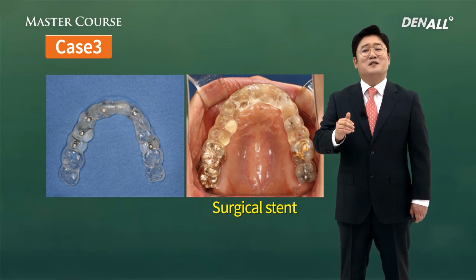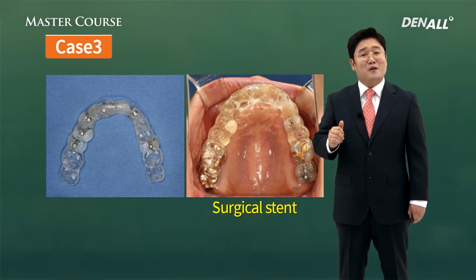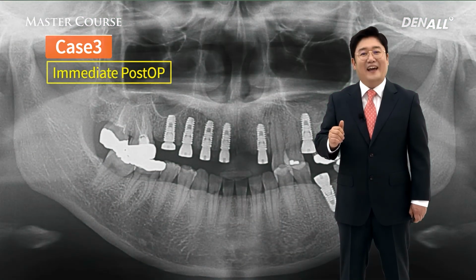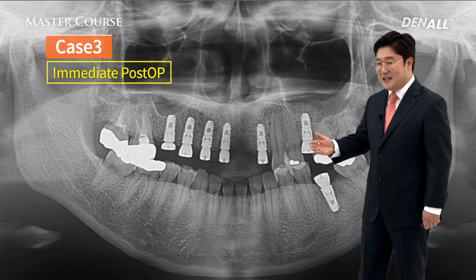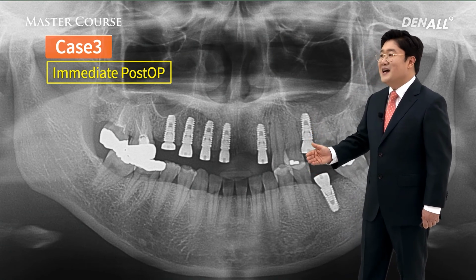In the past, when we did not have digital or CBCT, this was the most advanced technique. After surgery on the panorama, you can see implants were placed very accurately.